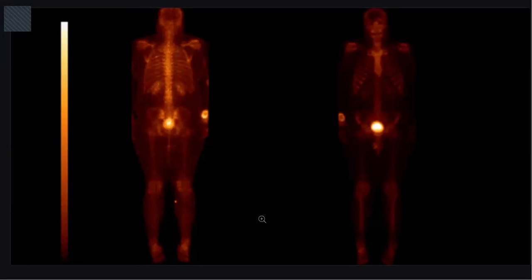Okay, no problem. In a bone scan, we have to see where the abnormal uptake is. First of all, in this technetium MDP bone scan, you have to detect whether it is a super scan or not. We can see the kidneys here. This is the frontal view, this is the posterior view.